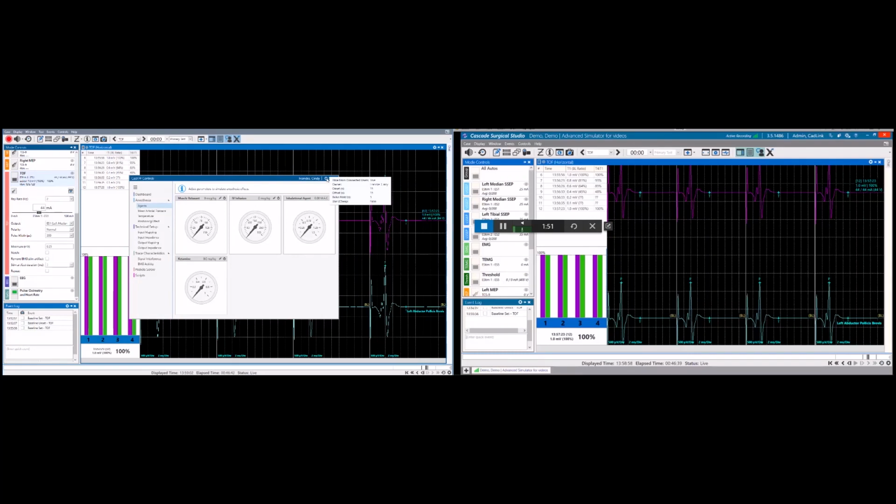and assigns the instructor as the owner of the control panel by clicking on the gear in the upper right-hand corner of the control panel. The owner of the control panel is shown in the footer. Use the drop-down menu to assign ownership of the control panel to any connected user. The instructor decides whether to hide the control panel from the other connected users. This is done by clicking on the Hide Connection box.